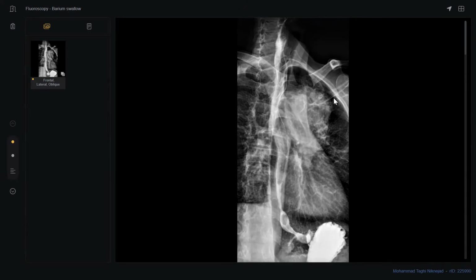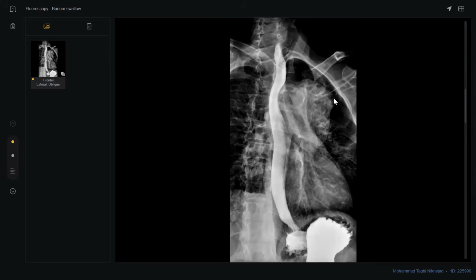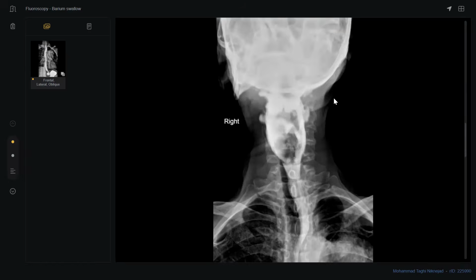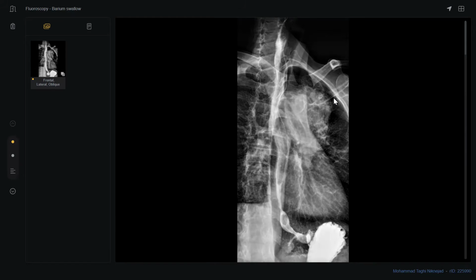Yes, sir. Okay, look, is this area changeable or fixed? It's remained fixed. Yeah, it's not changing. So is it related to contrast or not related to contrast? No, then not related to contrast. So what do you expect about it?